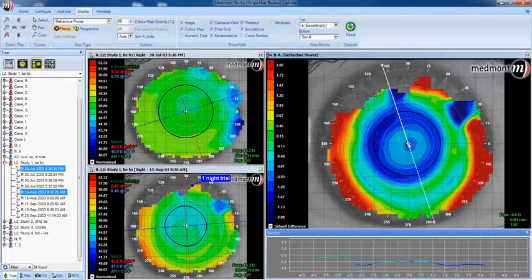You also note the refractive power map looks very similar to the axial subtraction map in the position of the treatment zone and the refractive change. You could also look at the refractive power map with the post-treatment exam alone and determine if the effect appears to be fairly spherical. Are you sphericalizing the pupillary zone, pushing any astigmatism out of the way, and placing the treatment zone where you would like it?